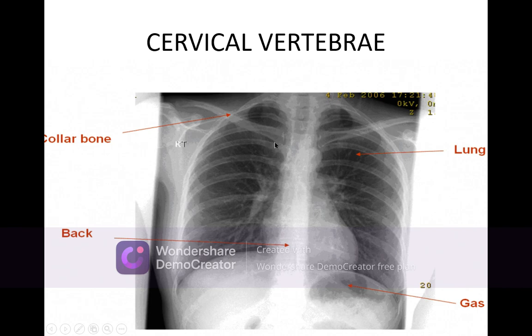Because the costal cartilage is not visible, it is attached to the manubrium sterni, and it will form the joint there. The second rib also attaches to the lower part of it. So this is where the first rib is arising.